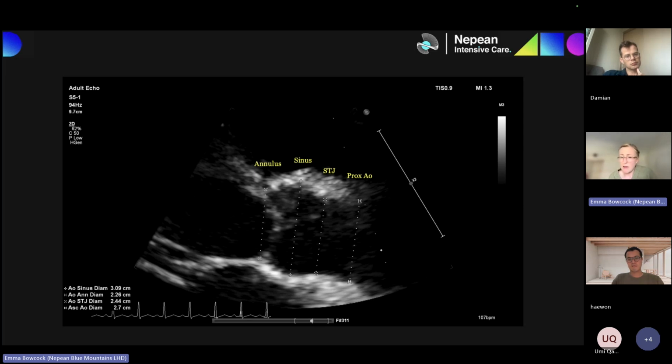As you can see, this is an imperfect measurement, isn't it? This is transthoracic zoomed in, you can't really clearly delineate the edges at the interface with the blood, and it's not a perfect measurement. So you might be out by a couple of millimeters. It is important to be perpendicular to the axis of the aorta when you're making these measurements. Sometimes you get really crisp imaging and it's easy. We use the leading edge to leading edge method in our lab. We follow the ASE guidelines, but just be mindful that there are those differences there.